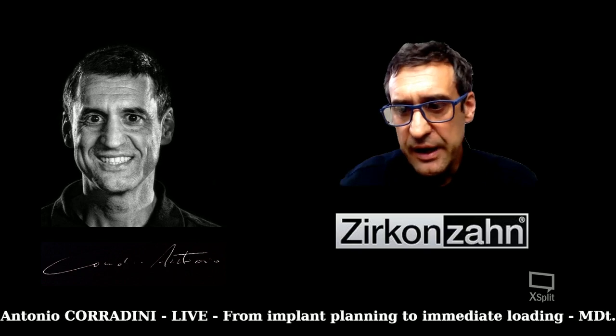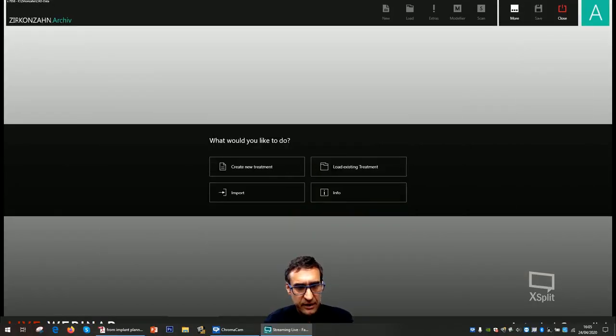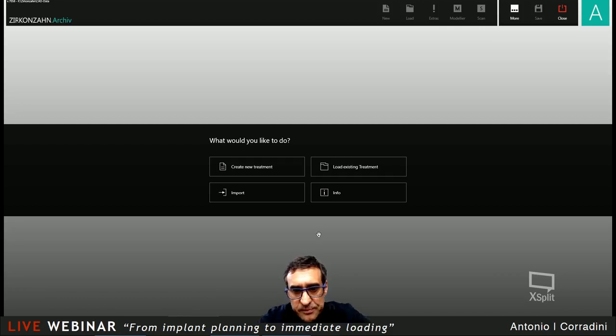webinar, and start from where? Start from finally the archive. No, the archive is basically the first step. So the archive is the software that allow us to create a project and to have an idea about what we would like to do.